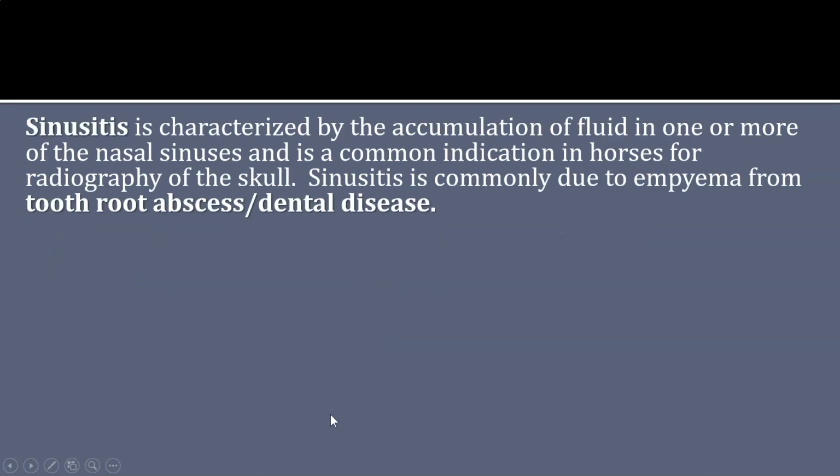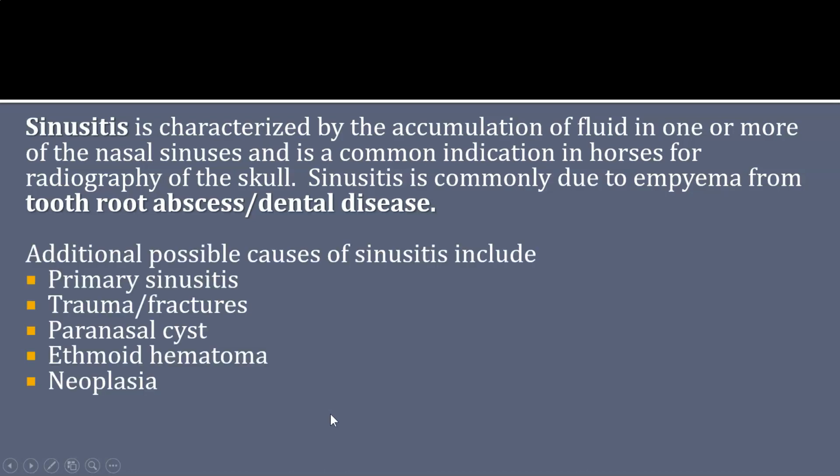Sinusitis is characterized by the accumulation of fluid in one or more of the nasal sinuses and is a common indication for radiography of the skull in horses. Sinusitis is commonly due to empyema from tooth root abscess or dental disease. However, there are several additional possible causes which are listed on the slide.